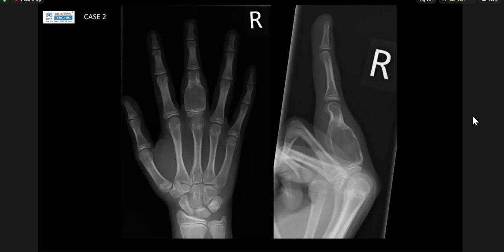So based on the presentation and the age of the patient and the location of the lesion, my first differential would be Enchondroma, and I have never seen ABC here, but it could be a simple bone cyst. Yeah, the lesion is more epimetaphyseal. Yeah. And so, would you be saying this is aggressive, non-aggressive? Would you be suggesting anything else?